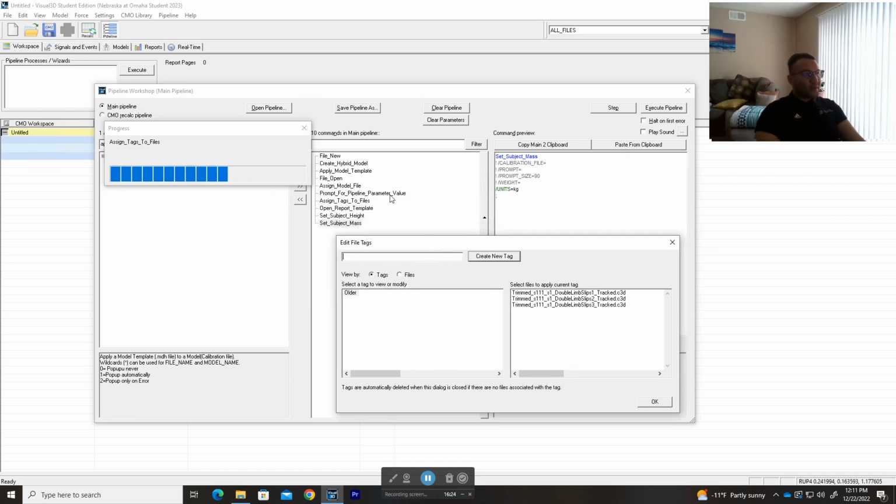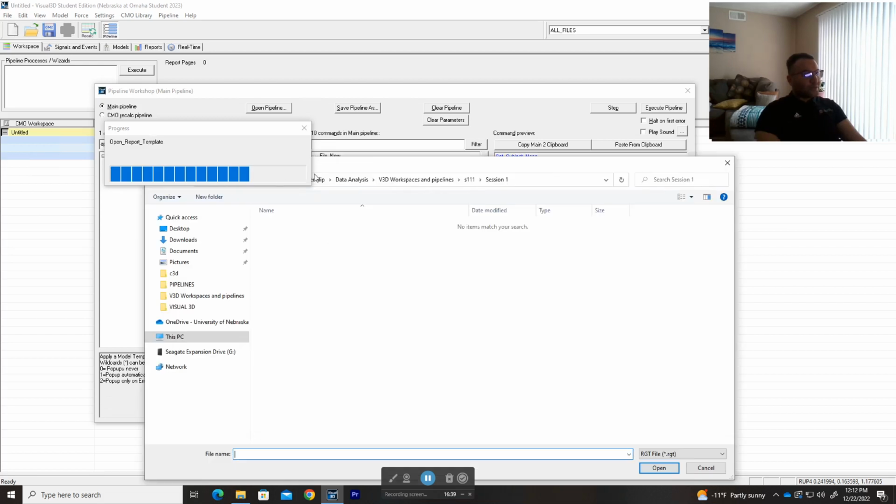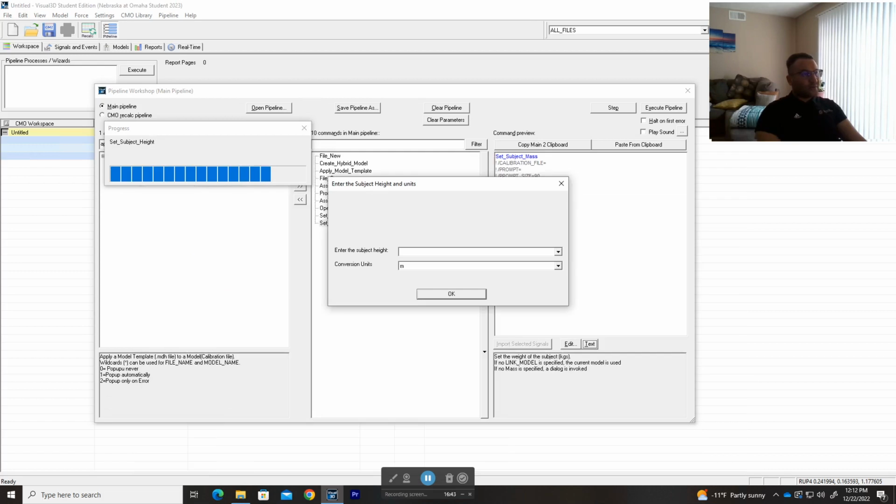So we want to assign all of these and hit OK. Now it's asking us for the report template. We don't care about that for now.